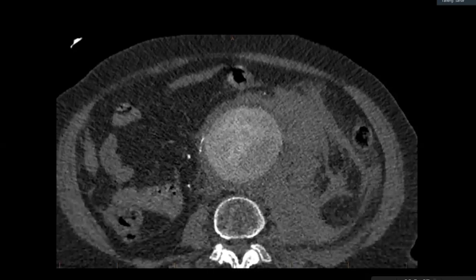I can see that it is surrounding the aorta and draped over the vertebra. In my provisional diagnosis, I would like to see the full extent of this ruptured aortic aneurysm, impending ruptured aortic aneurysm, sir. And I would like to refer it as an emergency to the IR section.